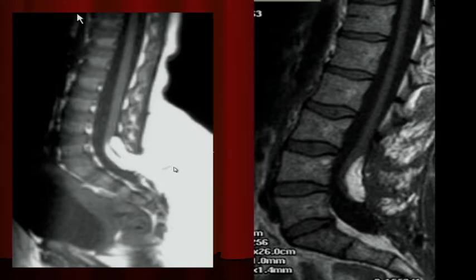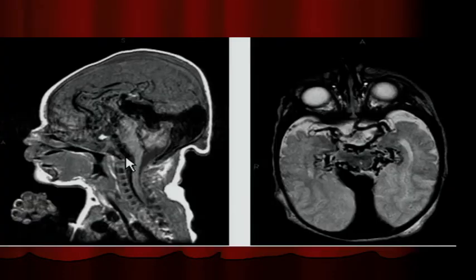This is a lipomyelomeningocele. Sir, on the Chiari's, there's a 1.5 as well. I can't remember what makes it a 1.5. I don't know. I think it's that 0.5 that makes it the 1.5. So it's the lipomyelomeningocele. Here is a very important thing. This might be diagnosed on a cranial ultrasound.